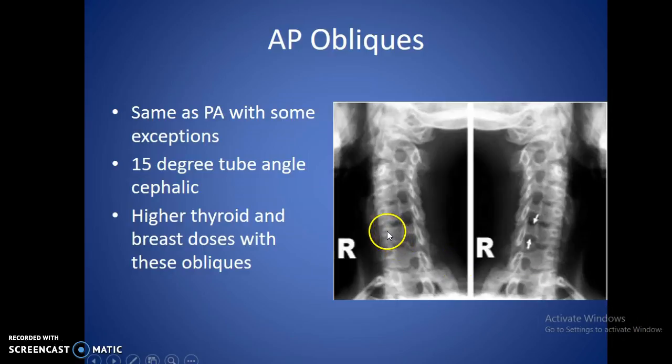You want to make sure that the pedicles are in the anterior portion of the vertebral body. So as you look at this little kind of squared portion here, the pedicles, these little round sections, should be in the anterior portions of that. They should not be too far back, or they should not be outside of that where it's going past the edge of the anterior body on there. You're going to see the little struts going across here. You've got one pedicle here, which means the other pedicle is going to show up right through here. So you're not going to see both pedicles, but they are going to look different because they are on opposite sides of the spine now.